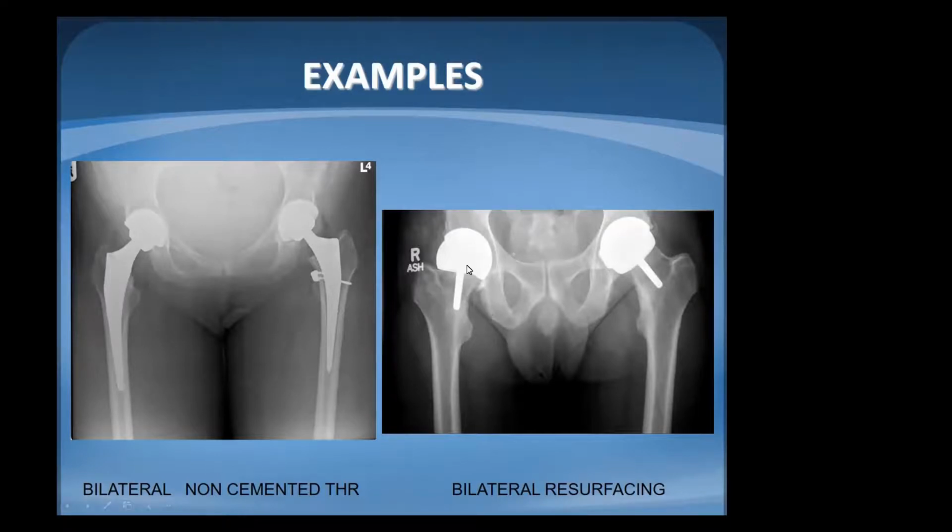I don't think you need to do any complex measurement to realize that this is not okay. They've done the best that they could do, and there is massive osteolysis in here. Okay, let's go to the next slide.